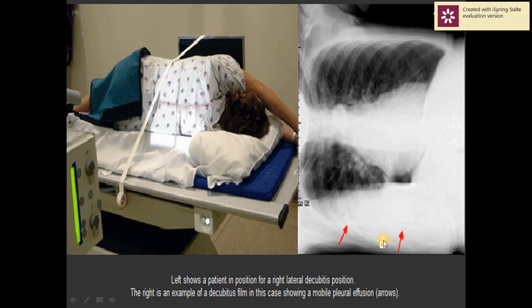If it is more than 1 centimeter from the lateral rib cage to the fluid, it denotes almost 200 milliliters of fluid, and you can easily take a diagnostic tap ultrasound guided. It also tells us it is not a loculated or complicated empyema.